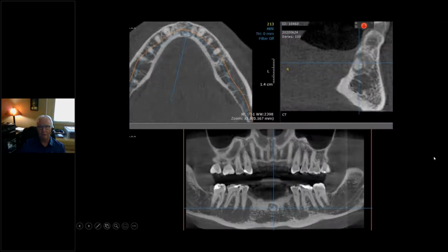These are thin sections and then slab renderings, but this is a mature stage lesion of PCD, periapical cemental dysplasia. And you can see it got a little bit larger, sort of more superiorly, so these can get fairly large, but as they get bigger and they're focal, we start to give them different names, and we'll move to that in just a second.